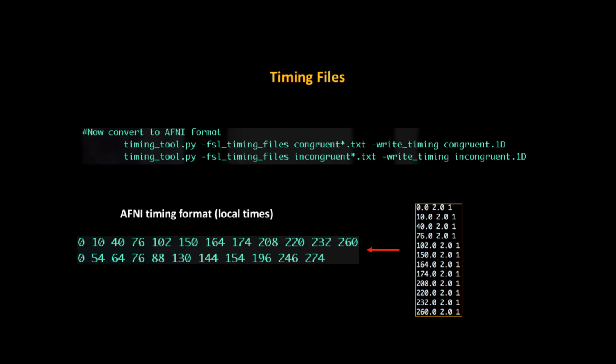And then the timings from the second run are run plus. Yes. So instead of this one starting at 0, it would start at whatever the total time for the first run was. Yeah. So there are different options.